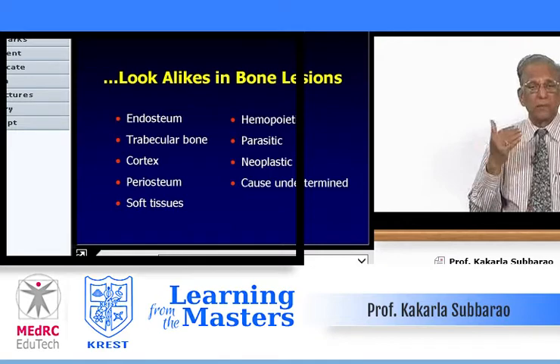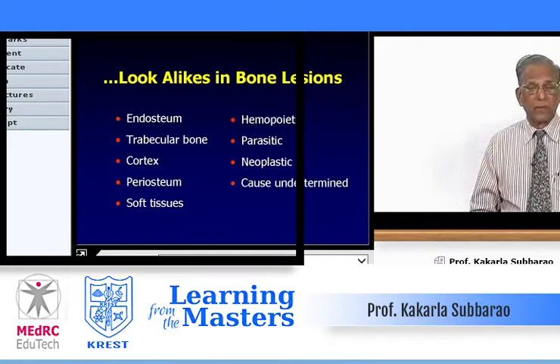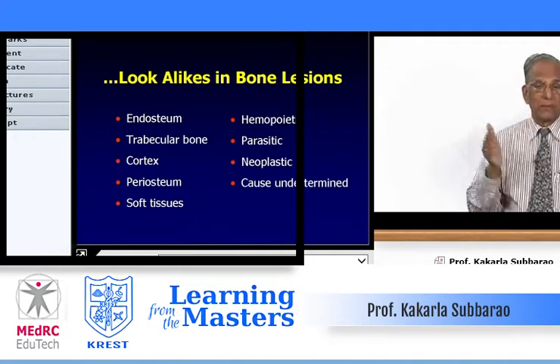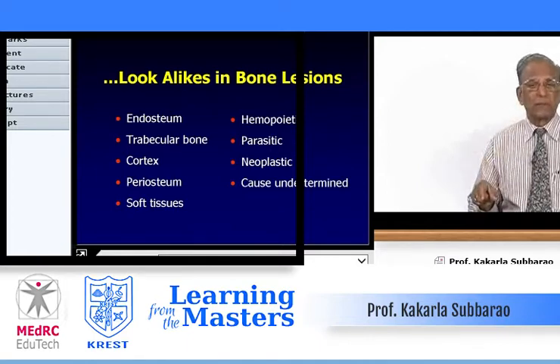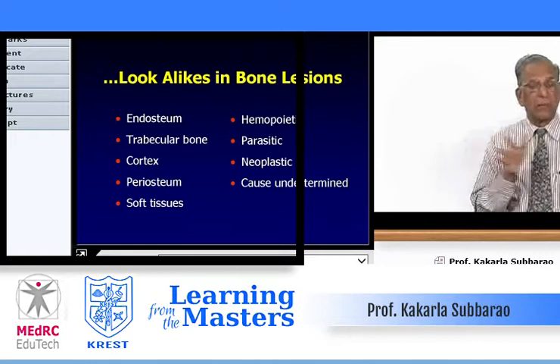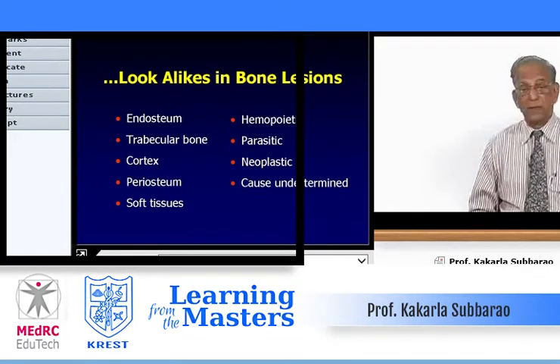So periosteum is important, and for example, if you take chondrosarcoma, the periosteum is velvety. That is, it is a slow growing chondrosarcoma. So part of it gets incorporated. When it gets incorporated, it doesn't get uniformly incorporated. It is carpet-like, wavy. Or sometimes you may get a Christmas tree appearance, where Sharpey's fibers calcify in a perpendicular fashion to the tubular bone. That definitely indicates malignancy.